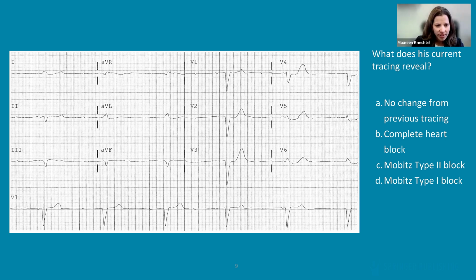If we look at this EKG, how do we know that? The key thing is that there is evidence of atrioventricular dissociation. Step one, we've got a slow heart rate. The heart rate is definitely slow, so there's bradycardia. The very next thing you want to look at is the rate, so we can count up 1, 2, 3, 4, 5, 6. So 6 QRS complexes in the rhythm strip along the bottom. We multiply that by 6 and get 36 beats per minute. So there is bradycardia.